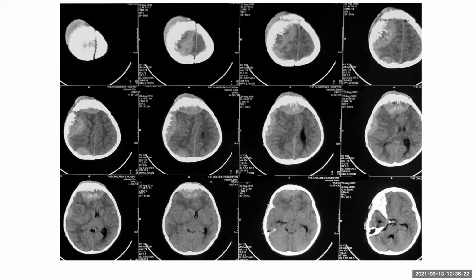This soft tissue thickening is causing mass effect on the underlying right cerebral hemisphere with some vasogenic edematous change in the underlying brain parenchyma. That shows gross spiculated changes.